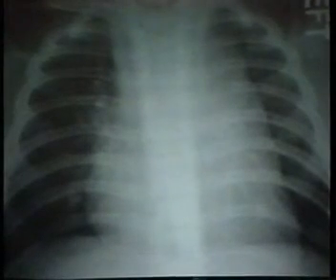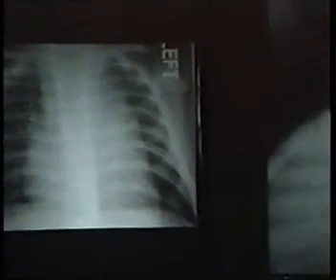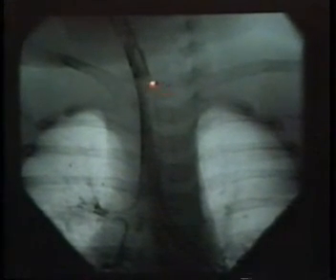This was a second patient who had symptoms of respiratory obstruction, normal chest films, normal airway film, but at bronchoscopy, an anterior pulsatile impression upon the trachea. Here's the airway film. My colleague, who will remain unnamed, thought there might be an abnormality in the trachea here, and I was asked to perform a tracheogram on this as we got off the loop here, and this illustrates one of the errors, I think, in doing tracheograms. The tracheogram was normal in all projections.